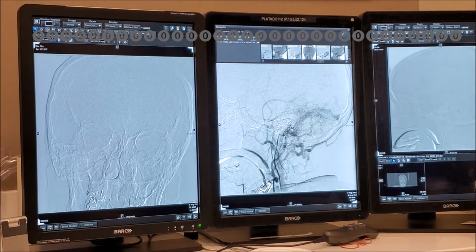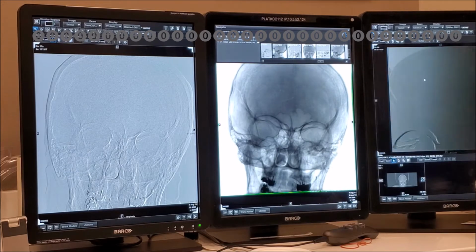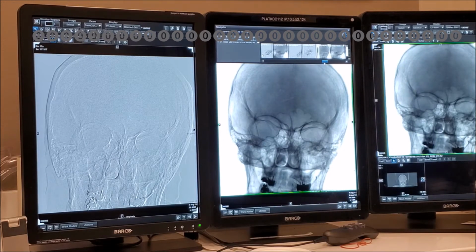And now you're more selective in the occipital. What's going on this way? Yes, sometimes you have to push the downward arrow to go to the next. If you click the downward arrow, it will go to the right. The which arrow? This one? Like the downward facing one? Yeah, that's it. Oh, I just click on the image. Click on the image and then click on the downward arrow. Oh no, click on the image. The big image, come down, click, and then press down. Oh, no, maybe not. I don't know. It's weird.